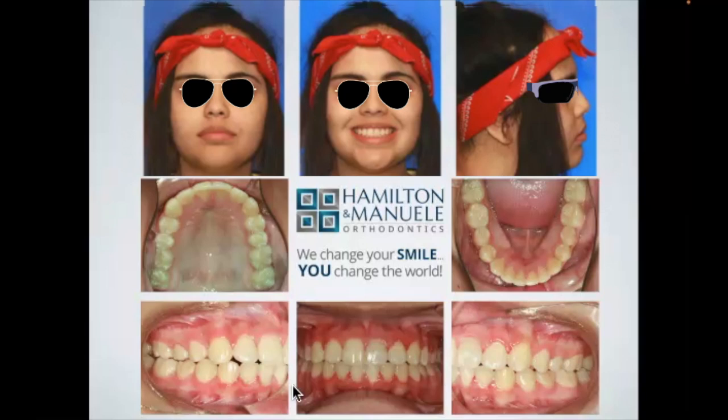Now, we didn't end up being able to correct the upper jaw entirely. We corrected it to some extent, but there's still a jaw size discrepancy. You can see that the upper teeth are tipped out. I mean, overall, the patient's happy with their smile. There weren't complications with the canine, so those were able to come in. The lower teeth are worn, okay? And I would say this is an argument.